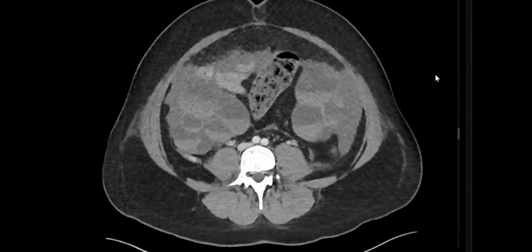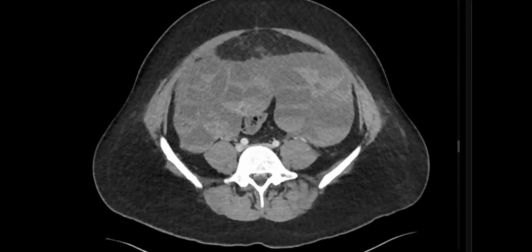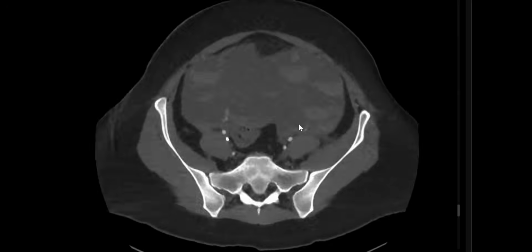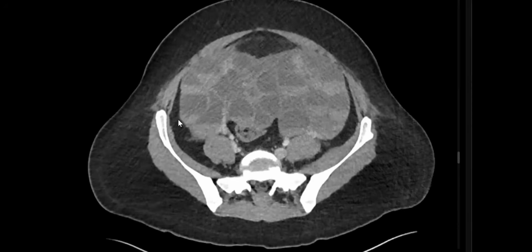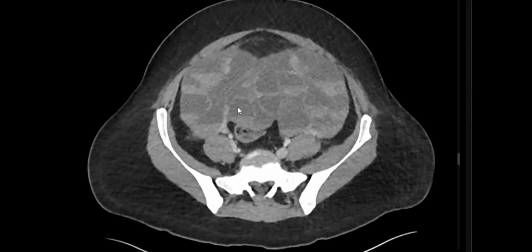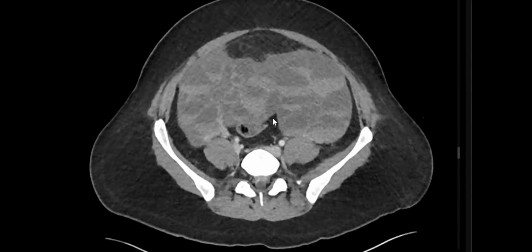The ovaries also show fluid levels, which are hyperdense. Very important. Can I take the mouse? Yes, sir. Even in the arterial phase, you still see fluid levels. In the venous phase, fluid levels. So it's hugely enlarged, both ovaries touching each other, containing multiple large cysts, and many of them hemorrhagic in nature. Okay, with ascites and effusion, again, the most common diagnosis is ovarian hyperstimulation syndrome.